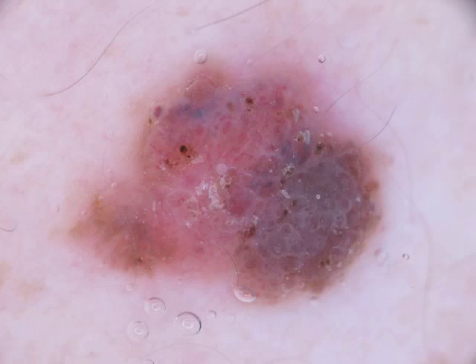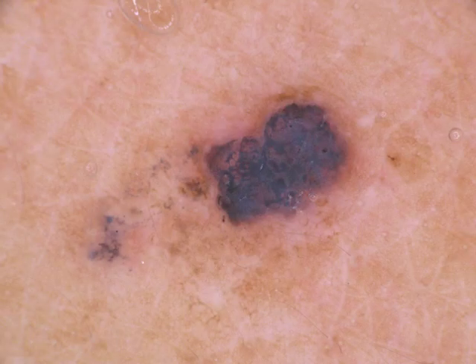Here, a classic example of a more thick melanoma showing asymmetry of color and structures and especially blue color. There is no evidence of network in this case. And here, an example of a lesion which is definitely asymmetric in color and structures, and also definitely showing blue-white coloration. In this case, the lesion should be considered suspicious, but this was not melanoma, but it was BCC. So this rule is really useful also for the diagnosis of pigmented basal cell carcinoma.